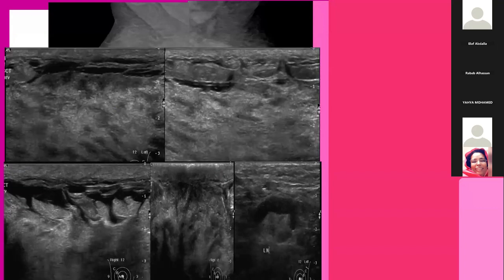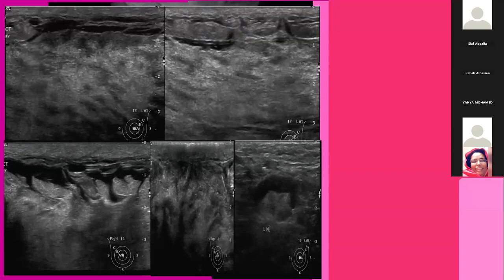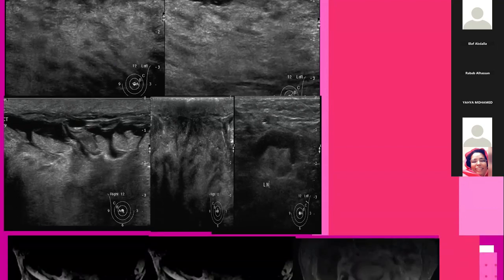Ultrasound demonstrates extensive edema with diffuse increased echogenicity, swollen fat lobules, subcutaneous dilated lymphatics, and fluid tracking into the interstitial fat planes, okay, skin thickening, but suspicious axillary lymph nodes seen on both sides. So that makes it more suspicious rather than just a systemic cause.